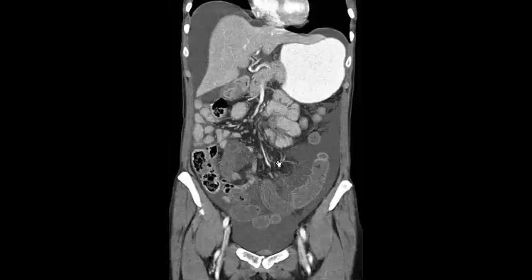It's not CT angiography where you have the full phases, venous and arterial phase. But to be honest, I already see that the marginal arteries going through, supplying these bowel loops, are not enhancing. I can imagine that the branches which are going to supply these bowel loops are not enhancing. So from just this image, I think you will put arterial ischemia as first. Yeah, first.